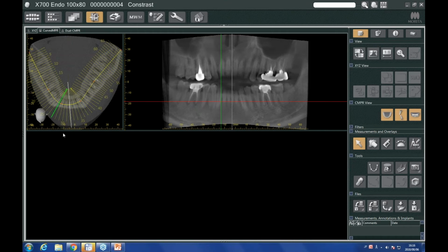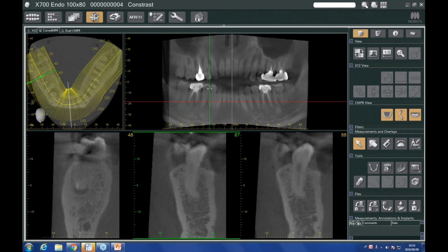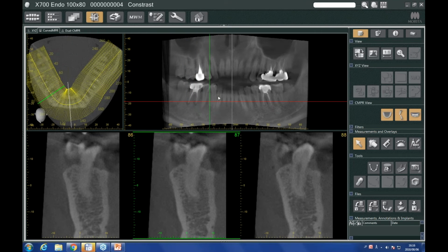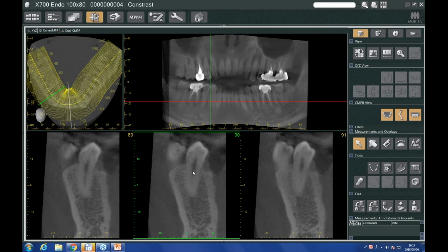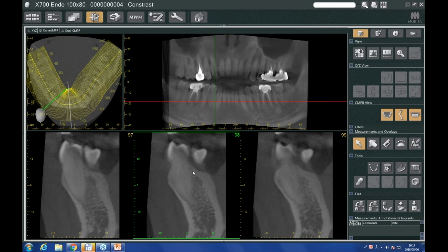millimeter, and it will generate a huge number of slices because, again, 0.5 millimeter over the entire volume gives us approximately 270 odd images. But now, when I rotate or scroll through these images, every time I move that line, and again, I'm doing this with my scroll wheel, it's moving 0.5 millimeter through the volume.